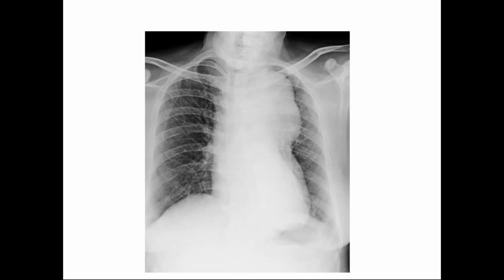Another emergency which we can easily miss is an aneurysm, because the patient presents with either chest or abdominal pain, which we might think of as a myocardial infarction or a simple gastritis. A simple radiograph can be used to identify large aneurysms. Here in this PA radiograph, we can see there is a large aortic aneurysm, which is seen as a radiodensity noted in the left upper zone of the lung.